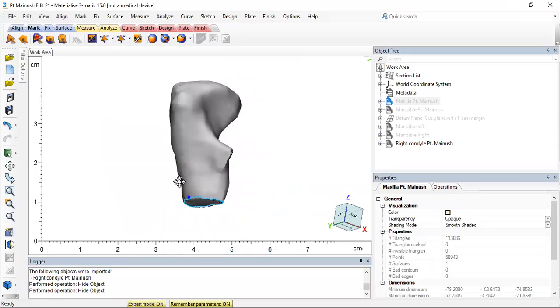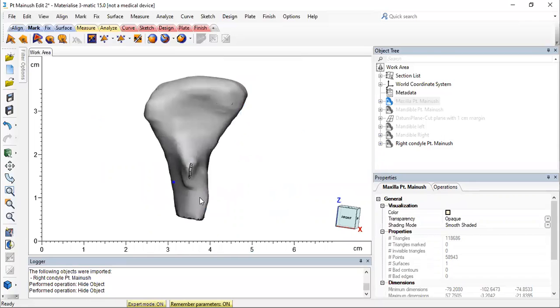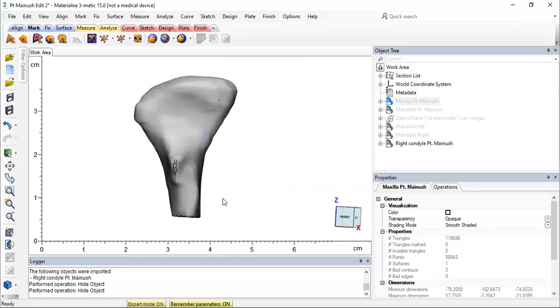If I would have just copied my condyle from Mimics to 3-matic, this option would not be possible. And that's the reason there is an option of export. Somebody was asking me a day before why you have to export when you can just copy paste it. There are two reasons why you have the export option in Mimics. One is that you generally don't use 3-matic as a CAD designing software. There are other freewares also like MeshMixer, Blender. You can take the exported STL into those CAD designing softwares and do whatever further necessary actions you want to do on the STL.